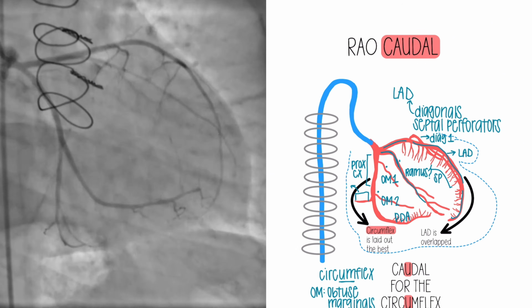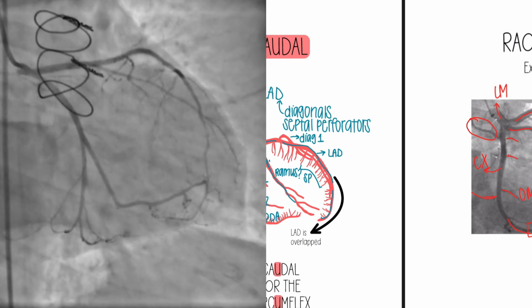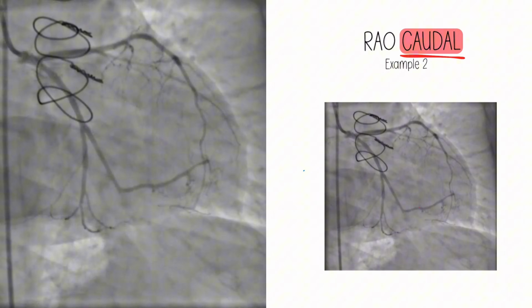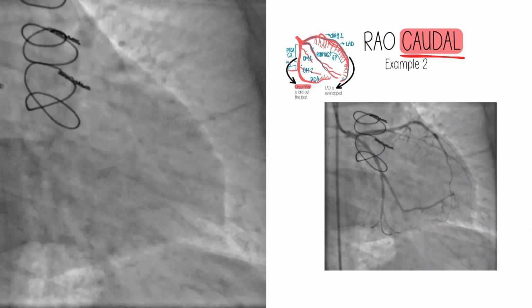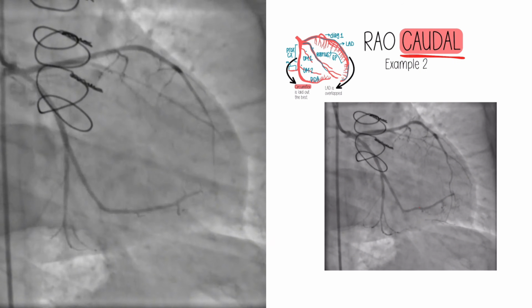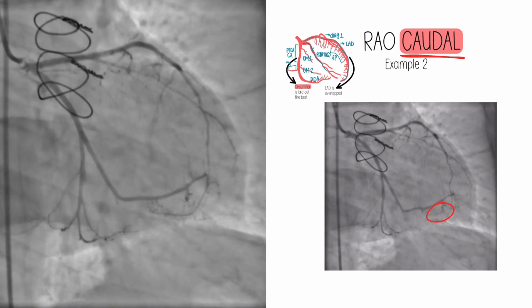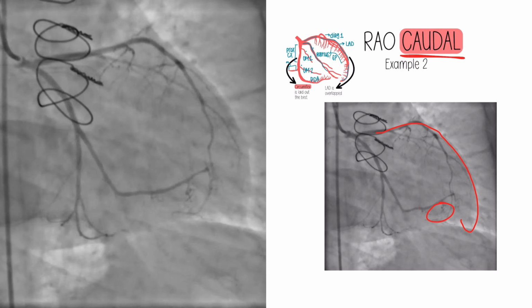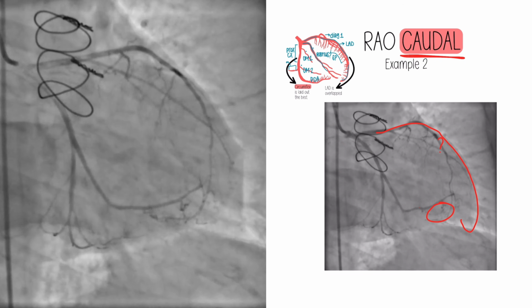If you know what perfect normal anatomy looks like, then you apply that to the diseased anatomy you're currently looking at as a landmark to figure out, okay, is anything missing? Are all of my main vessels here? Maybe there's some collateralization going on, because I know the LAD should really be big and robust going along this anterior wall, and it's not. So is it maybe occluded somewhere?